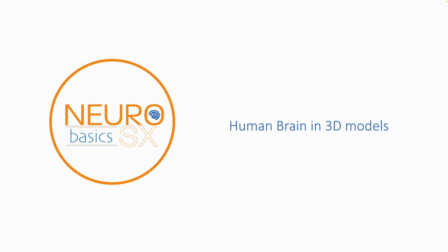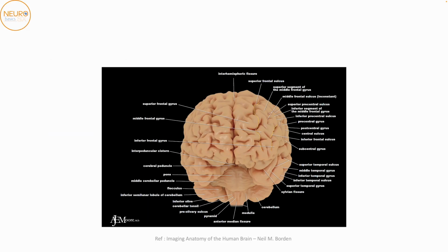Before we get into the anatomy of the MRI images itself, let's have a very quick overview of some basic anatomic findings in a normal brain. If we do that, we'll be able to understand the images much quicker. So we know there's a frontal, parietal, occipital, and temporal lobe, and the different gyri and sulci present within these lobes. Hopefully, we're all aware of that by now.